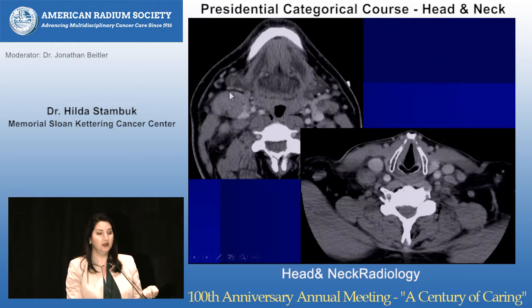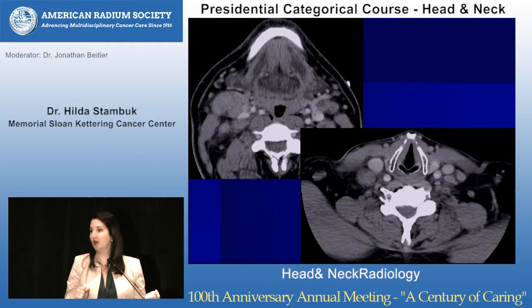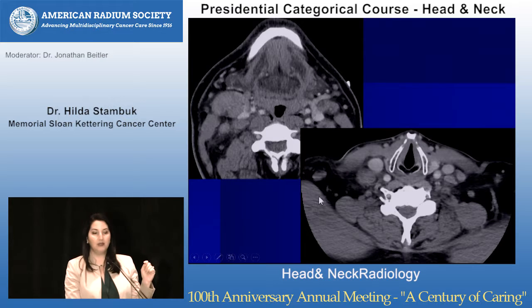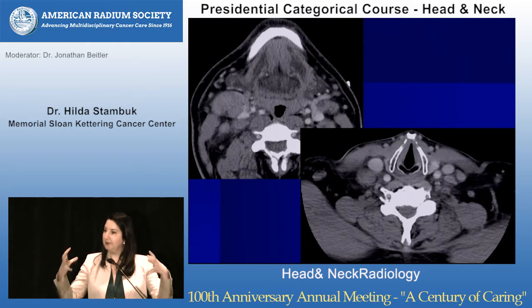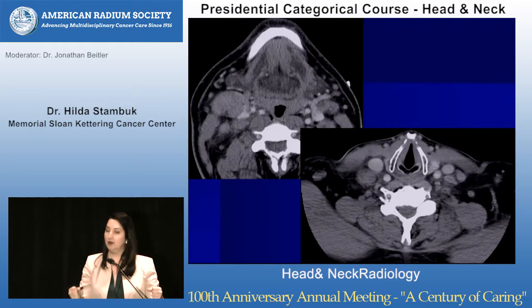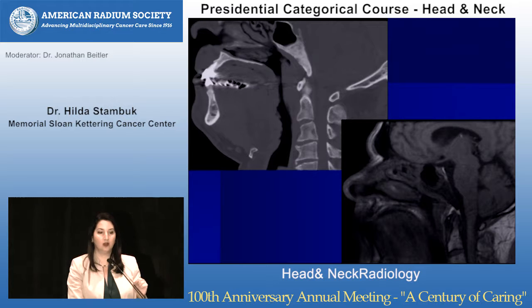So the first thing I notice is, yes, there's bulky lymphadenopathy in the neck bilaterally, even in level 5. So knowing that there's bilateral neck disease, including level 5, that's classic nasopharyngeal carcinoma. So that's what I'm thinking immediately. It could be lymphoma, except there is gross extracapsular spread of disease from these lymph nodes. And lymphoma generally, when it presents, are beautiful, fat, well-defined lymph nodes, no extracapsular spread of disease. So I'm thinking this is more of a pattern of nasopharyngeal carcinoma.